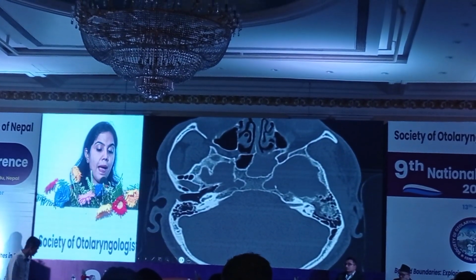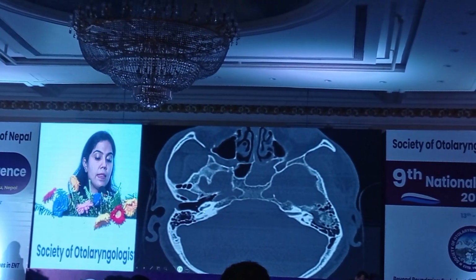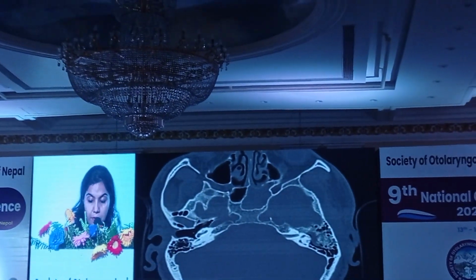This is the smiley sign of the cochlea, and this is my round window. This will be the round window, and its anatomy is very important for the surgeons who are doing cochlear implant.